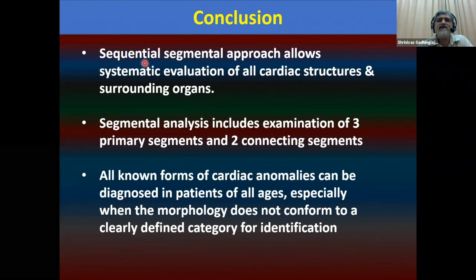So this is how you can do the sequential segmental analysis, and step by step you can identify all the cardiac structures.